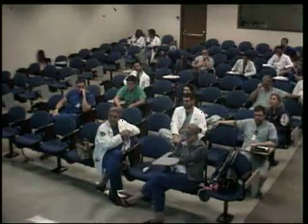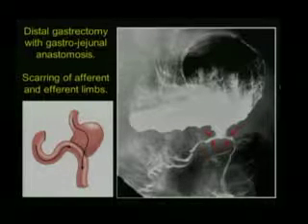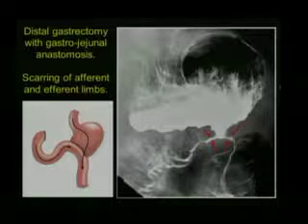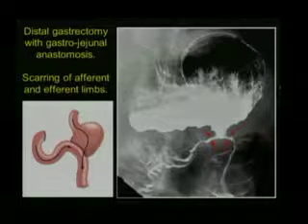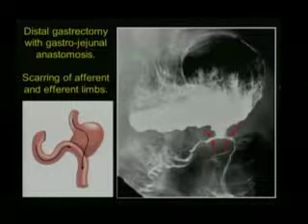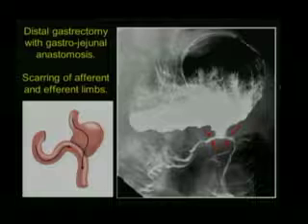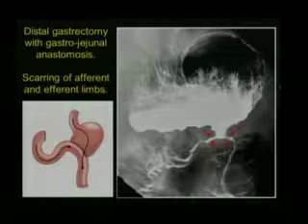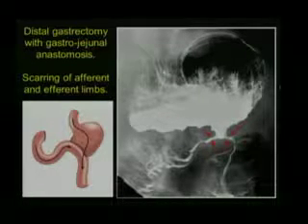Congratulations. Okay, so this is the anatomy, and definitely there is a stricture due to scarring at the level of the anastomosis. How can you tell that it's isoperistaltic? If you don't see this part, there's no way to know. But your afferent limb is up in, is it right across? I don't know. In this case, I don't know if it's isoperistaltic or antiperistaltic. If you don't see the rest of the anatomy, personally, I don't know how to tell. But definitely there is a stricture there. Okay, so the surgeons should know about that.